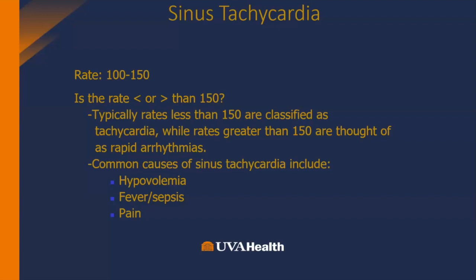And that intrinsic pacemaker goes up to about 100. We can think of that as normal. Beyond that, it's a little bit abnormal and we want to know why. So we should start to look for causes here as to why that's happening. Again, we don't want to treat the rate. We don't give this person a beta blocker, a calcium channel blocker. We don't make them vagal down. And that's because the rhythm is responding to some insult, and we don't want to take away that compensatory mechanism.